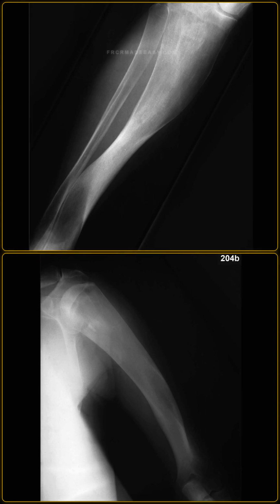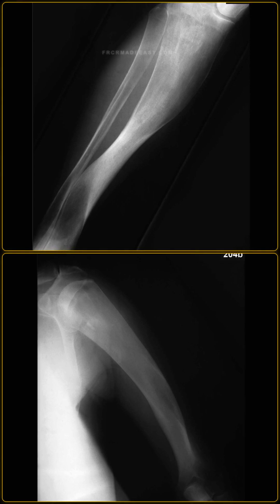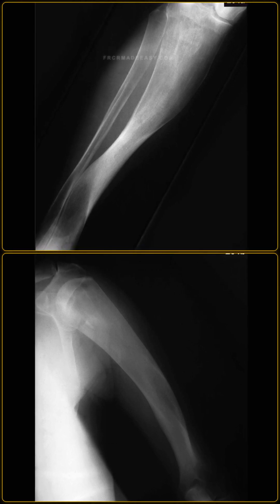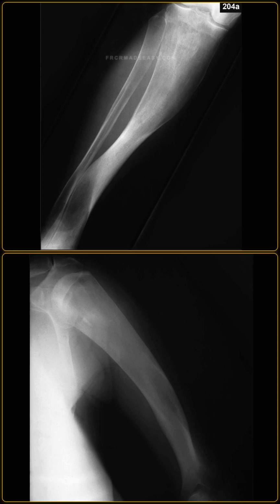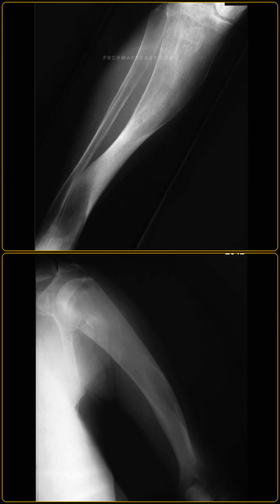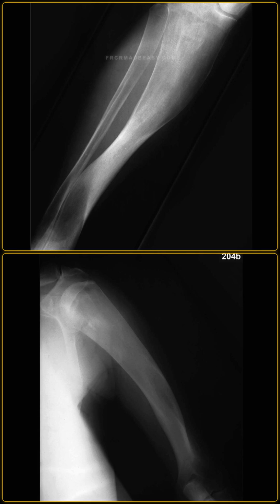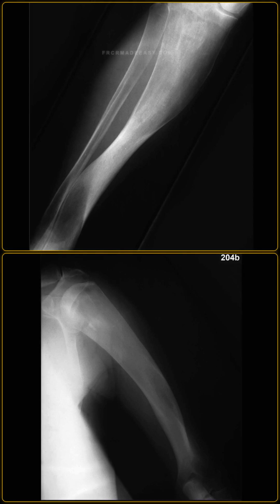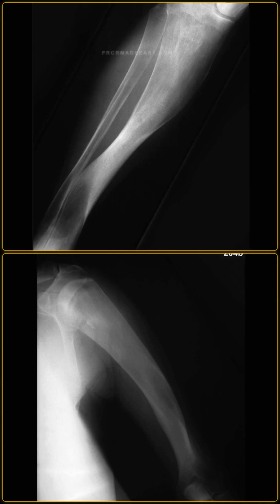As seen in this radiograph of the humerus, there is a similar Erlenmeyer flask deformity with marked metaphyseal flaring, relative diaphyseal sclerosis, and bowing. Pyle's disease is a rare autosomal recessive disorder where patients are usually asymptomatic aside from cosmetic deformities like genu valgum. Craniometaphyseal dysplasia presents with essentially the same long bone features, but it is additionally characterized by sclerosis of the skull base, which leads to cranial nerve palsies.